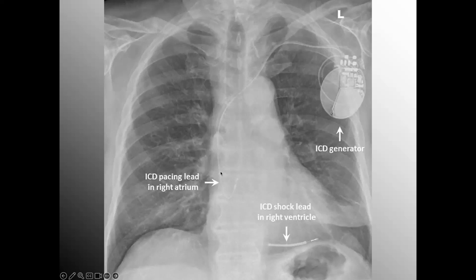You've got cardiac. Right anterior border is seemingly silhouetting with the spine, which happens on occasion. And on the left-hand side, it's fairly delineated until we get near the midlung. Now, could it be breast tissue? Well, I don't have it on the right, and I don't know this patient's history. I'm going to make the assumption we could have an infiltrate, maybe even a little loculated effusion here.